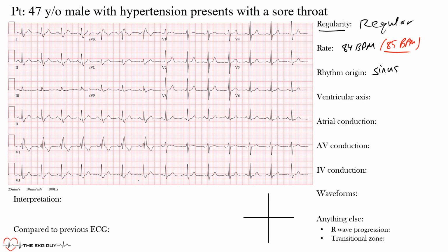Okay, so the P wave has an axis. Now there's also a ventricular axis in this case, and we're going to focus on the R wave or QRS axis. Okay, there's also a T wave axis, ST segment axis, but we're going to focus on the ventricular or R wave or QRS axis. Okay, and because we say that, we're going to be focusing on these big complexes. So normal ventricular axis in an adult lies between -30 and positive 110 degrees.